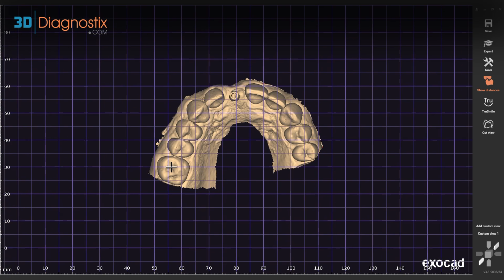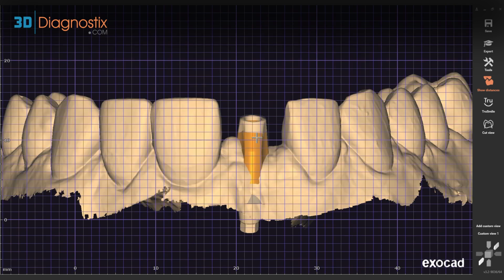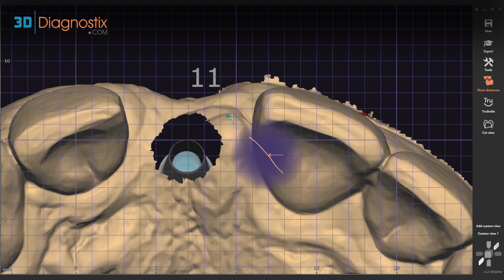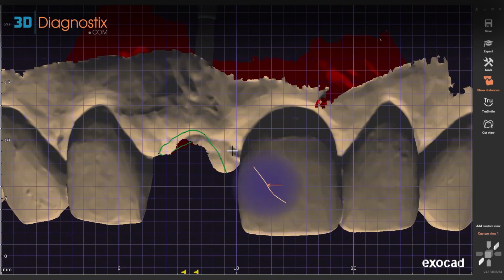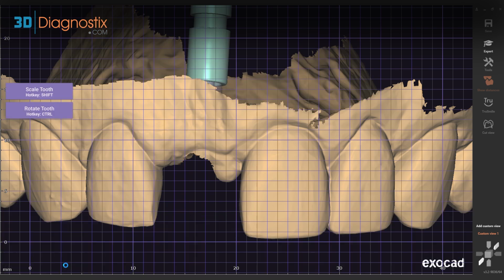With the implant position finalized, we move on to designing the screw-retained restoration. For this maxillary central incisor case, the process begins by importing the model scans and the plan, then positioning the planned implant scan body for maximum precision. An emergence profile outline is then drawn around the desired tissue emergence. Given the anatomy of a central incisor, a triangular emergence profile is ideal, enabling a natural and aesthetic transition from the implant platform to the cervical contours of the restoration.